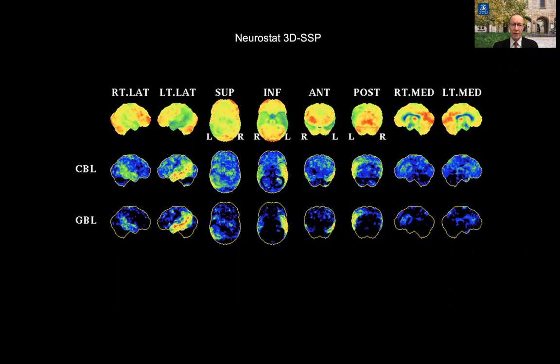Alzheimer's disease is by and large driven by memory decline. But in some cases, the pathology, particularly the tau distribution and the neurodegeneration, affects other areas, leading to a language onset, logopenic aphasia, or a visuoconstructional confusional sort of problem, which is the posterior cortical atrophy variant. And even occasionally, you can get the frontal or dysexecutive variant of Alzheimer's disease. So in this case, it's typical logopenic aphasia, with memory relatively intact, so we're not seeing much reduction or involvement in the limbic memory circuits, which include the posterior cingulate precuneus cortex.